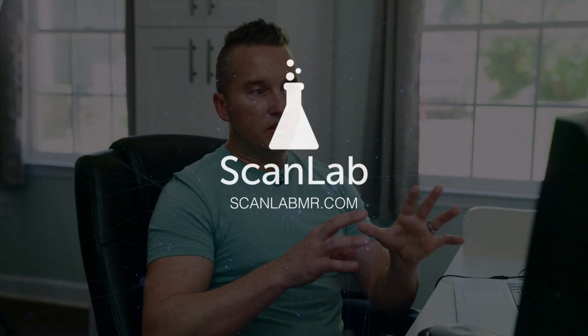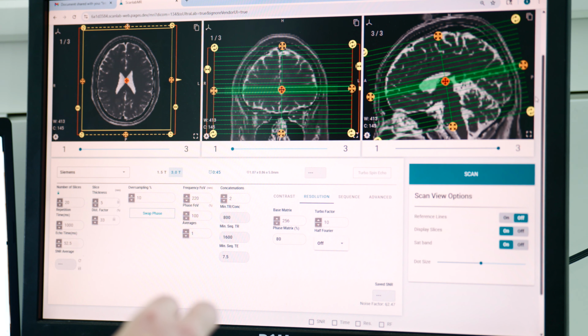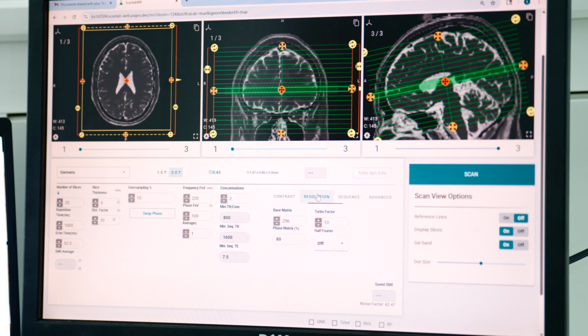All right, so this is a good place for us to discuss this new feature of SNR. We've put it in the context of the UltraLab. And if you recall, the UltraLab is where we take all of the most commonly used parameters that impact SNR and time and resolution, RF, all of those things, and put them in one interface.